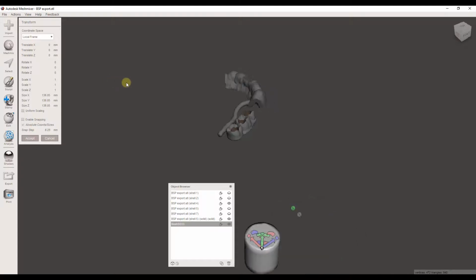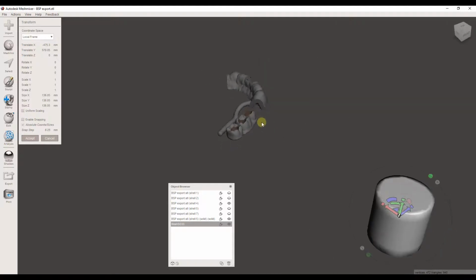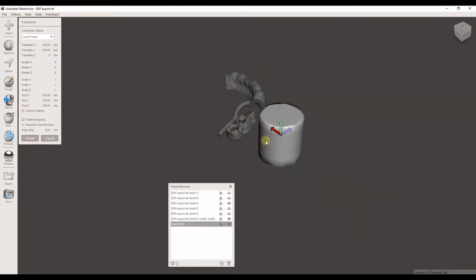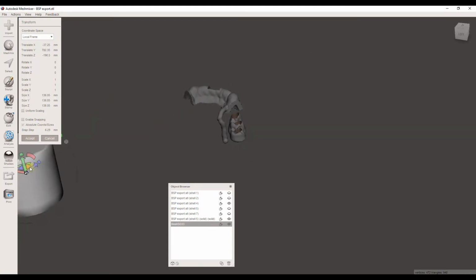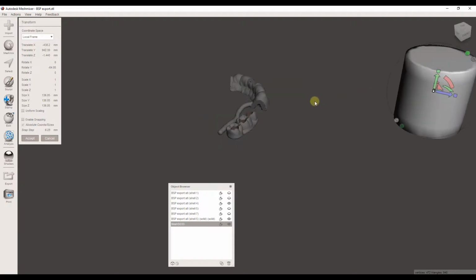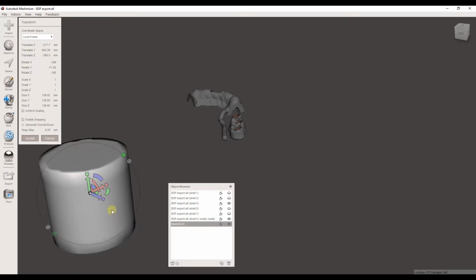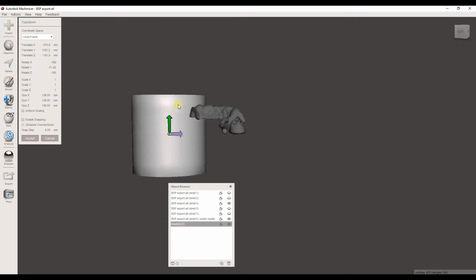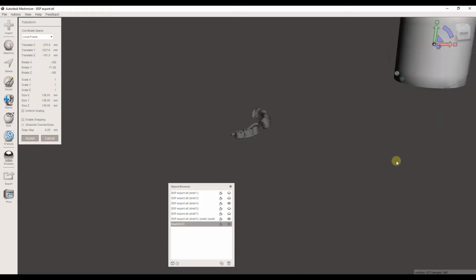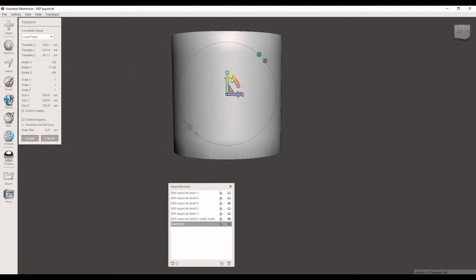And this gets kind of tricky here, where you're going to want to move this in to be close to your main object, the prosthesis that we're working with here. Well, that'll drive you nuts. There.